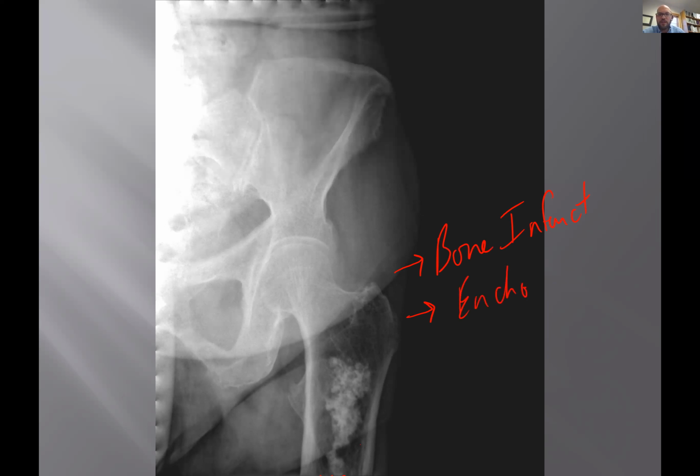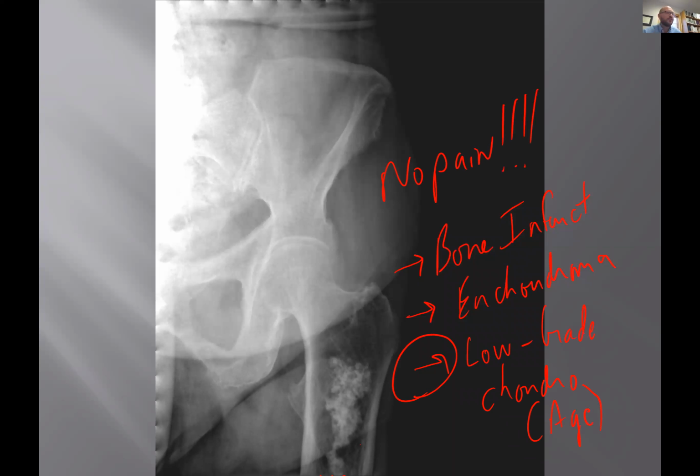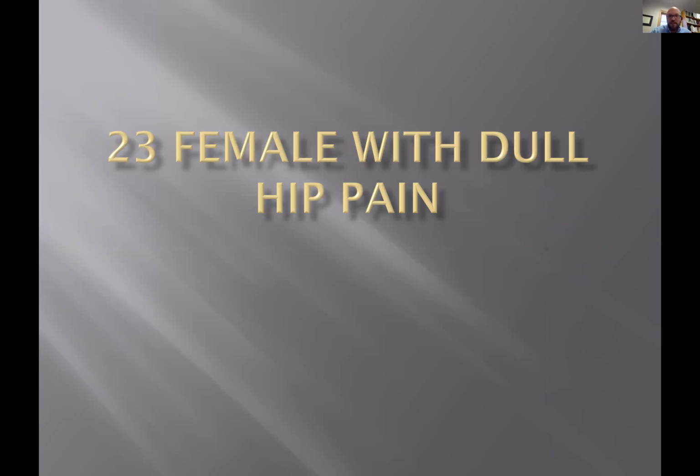Enchondroma. Right. But then you're always having to worry about this. Low-grade chondro. Especially because of the age, right? But it does not hurt. There's no pain. So no self-respecting chondrosarcoma is going to be painless.